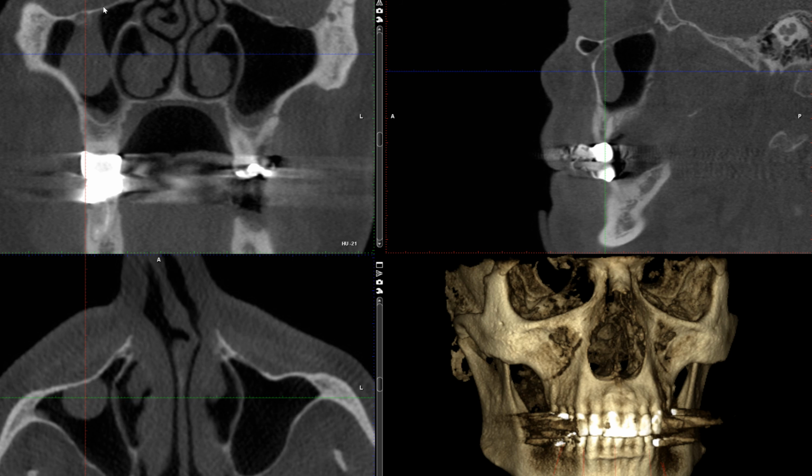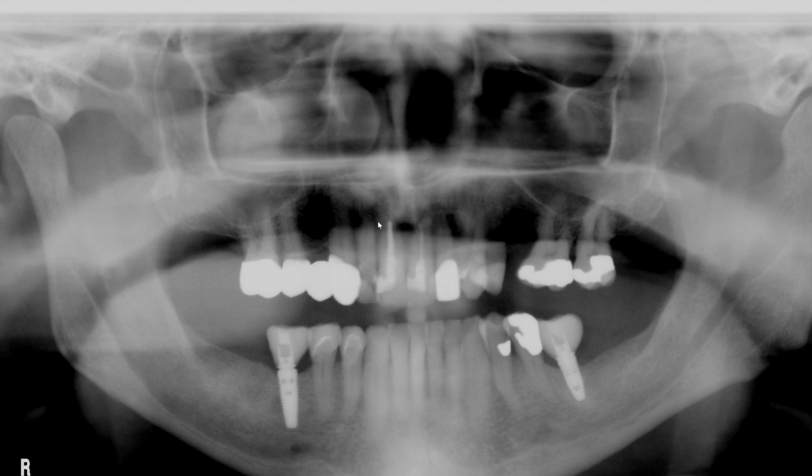So yeah, again, the more you see cone beam CT images, you will realize that it actually makes diagnosis a lot more fun and perhaps easier in many cases, because you have actual anatomic data, whereas going back to that image, it's a superimposition of three-dimensional anatomic structures. And when you do that, you create a superimposed image that can be more difficult to make a proper diagnosis. So, before we finish, I want to show you the turbinate.